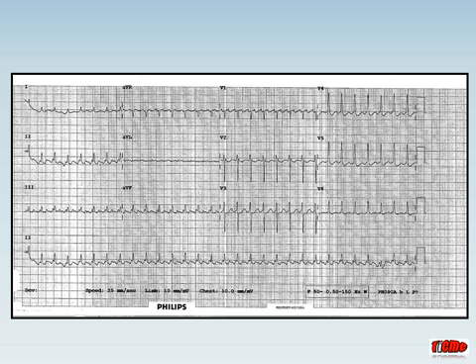Here's another example of atrial flutter with 2-to-1 block, but the ventricular rate is actually sped up. Now remember what I said about flutter. The flutter waves can be from 260 to 360 beats per minute. So if we look at the flutter waves that are pretty obvious up here in V1, they're actually faster than once every big square. So this is actually flutter with a flutter rate of about 360, giving us a ventricular rate of 180. So this is the fastest flutter I've ever seen.